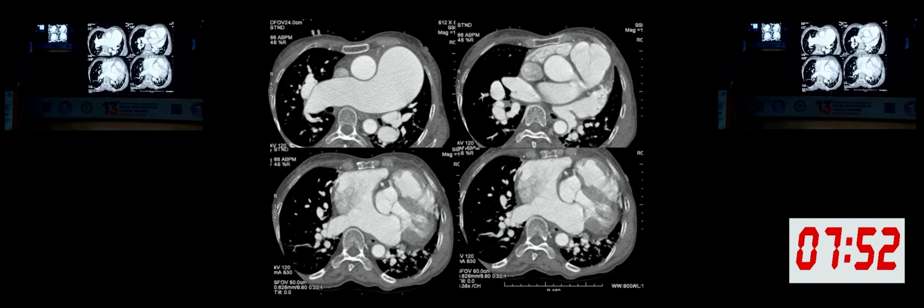Now, when we did a CT angio, we could make out that the aneurysmally dilated main pulmonary artery was compressing the left main and causing severe stenosis, which was thought to be the cause for her chest pain. These are the pictures playing around with VRT, just to show that there's a huge dilated main pulmonary artery compressing over the left main, and they went ahead and did a stenting. She doesn't have chest pain anymore.